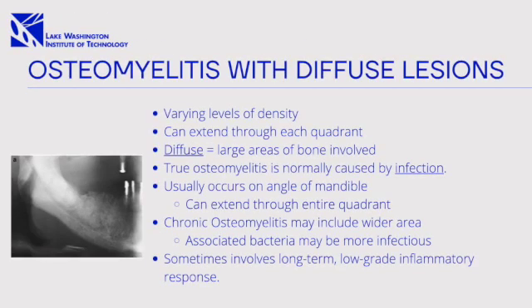Osteomyelitis with diffuse lesions. Radiopaque lesions may have varying levels of density and can extend through each quadrant. Osteomyelitis can be focal or diffuse depending on the extent of the bony involvement. If large areas of bone are involved, it is technically diffuse.